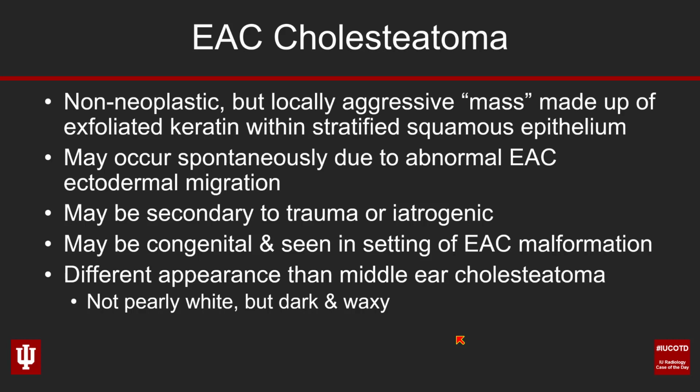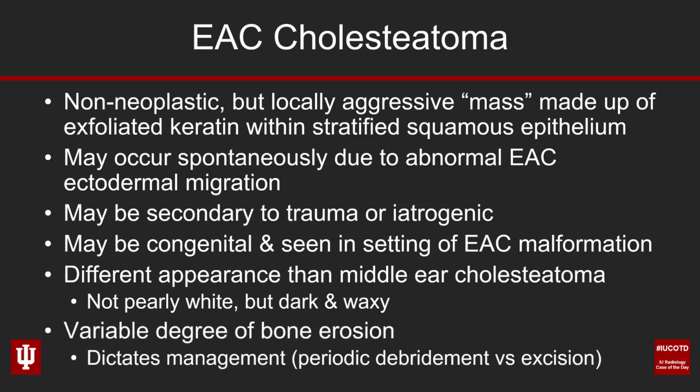Interestingly, on clinical grounds, these look different than middle ear cholesteatomas. They're not that pearly white appearance that we frequently associate with middle ear cholesteatomas, but rather these are oftentimes darker and more waxy in appearance. And they may have a variable degree of bone erosion. And that's important for you to report because that helps to dictate the management.